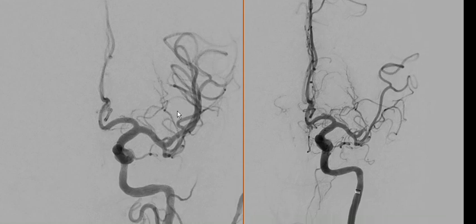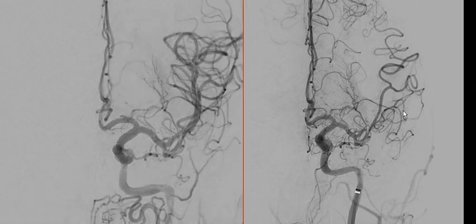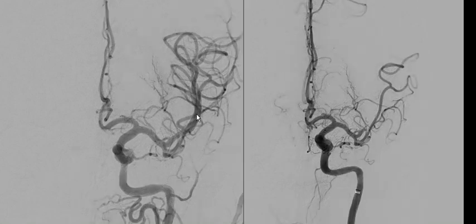So we have here after, the next day, the time of clot retrieval, more blood vessels in this vicinity than you can see here. So even as you roll through, lots more blood vessels and a distinct patch that's lacking in blood flow there. If we roll back, and we trace these back all the way, you'll see there is a point here that the blood vessel ends abruptly, and so that was where the blockage is. This is left mid-cerebral artery, allegedly M2, but I don't know how to tell that, and it's been unplugged and looks pretty good restoration of blood flow.